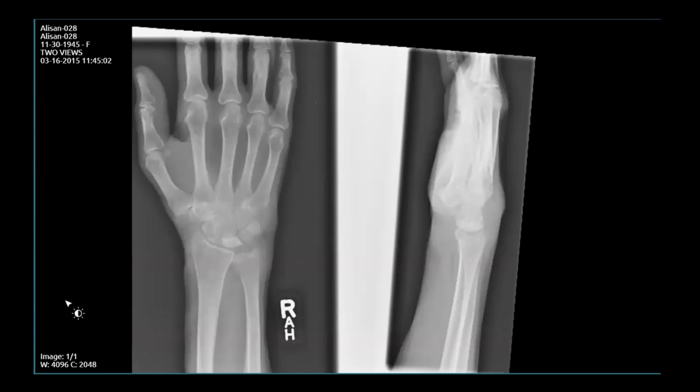If you have positive ulnar variance, you're more likely to get something called abutment. So you can get abutment between the lunate and your ulna, and you can get some sort of changes. But yes, negative ulnar variance is associated with Kienbock's, and they just need an orthopedic review.